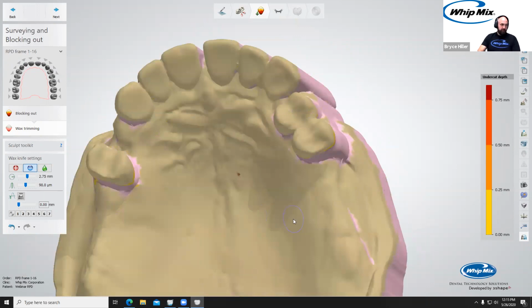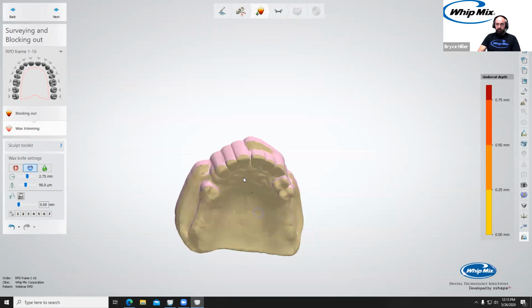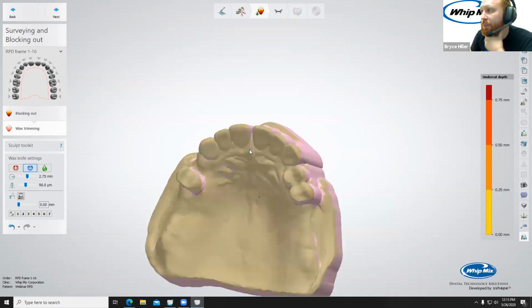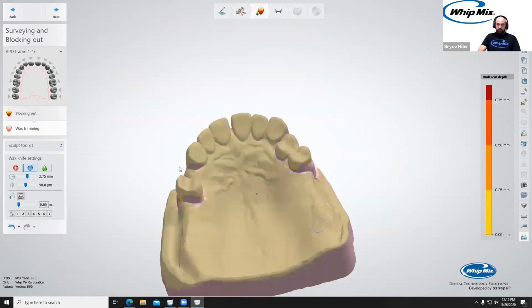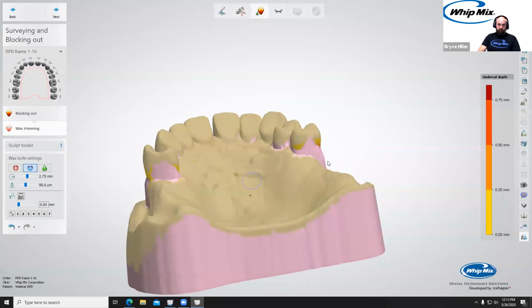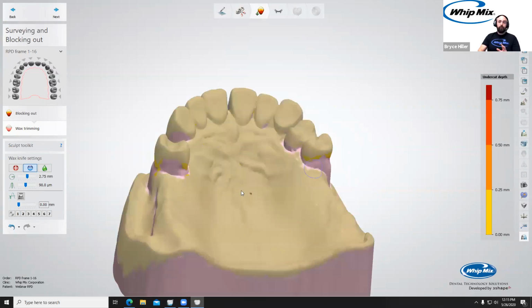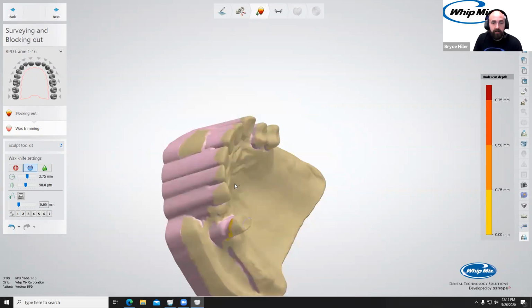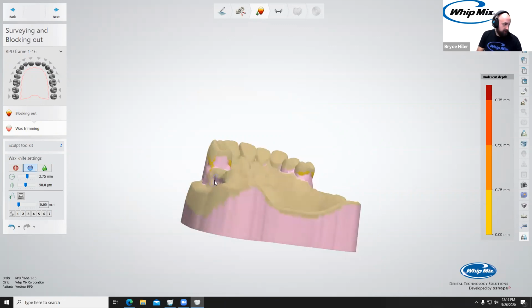This is from 3Shape's actual demo cases themselves. Most likely it was scanned in with just the monolithic mono scan, not the true texture scan, so we're not going to see any of those drawings on the cast itself. But that is something that's extremely helpful. And if you're in the market for getting a scanner, and you're looking to do RPDs, I would definitely get an E2 or greater. Just a little tip. Yeah, definitely.